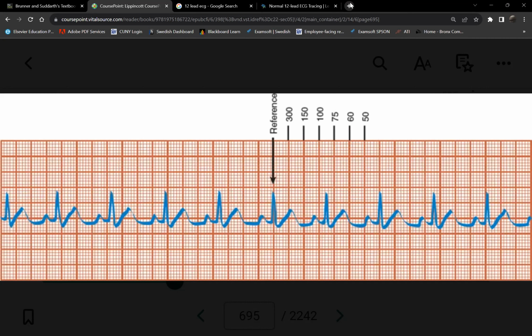So I'll count from here to here. The easiest way is what? Because I know 1 PQRST is 1 heartbeat, correct? So can I just count the PQRSTs within that 6-second strip? Can I count this one? No. Why not? Is this a complete heartbeat? No, it's missing the P, right? Okay, so can I count this one? Yes. Okay, let's count. 1, 2, 3, 4, 5, 6, 7, 8. Is it exactly 8?